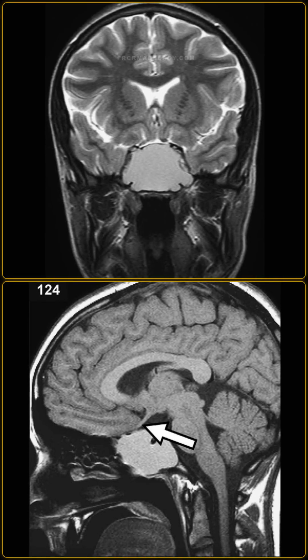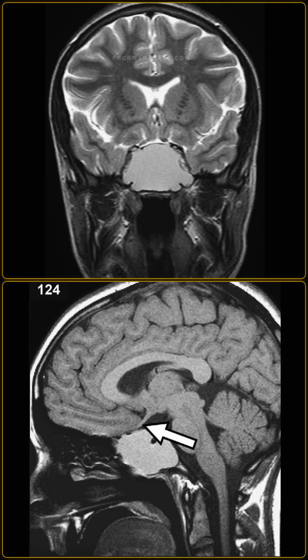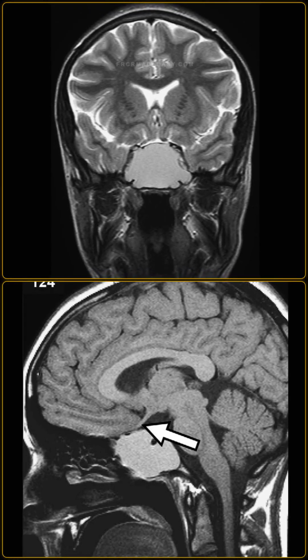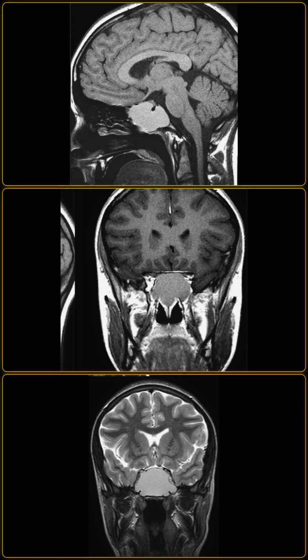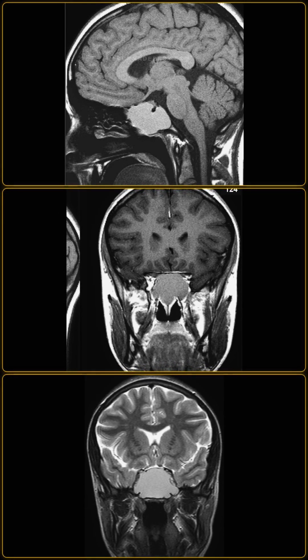A sphenoid carcinoma would present with aggressive osteolytic bone destruction and invasion of adjacent structures, rather than smooth remodeling. A pituitary macroadenoma would center on the sella turcica, expand the sella, and show uniform solid enhancement. Explain the pathophysiology, predisposing causes, and common locations of mucoceles.